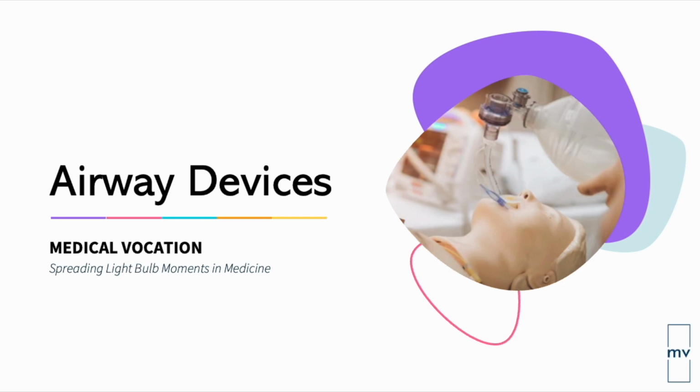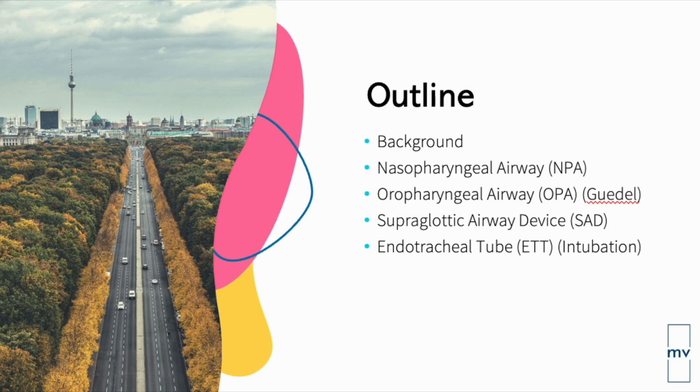So in this video we'll be talking through the various airway devices that I use clinically. As an outline, we'll go through a little bit about airway management as a whole, and then we'll move on and talk about our Nasopharyngeal Airway or our NPA, our Oropharyngeal Airway or our OPA, also known as Guedel, our Supraglottic airway devices or our SADs, and then our endotracheal tube as well, which is what we actually use for intubation.